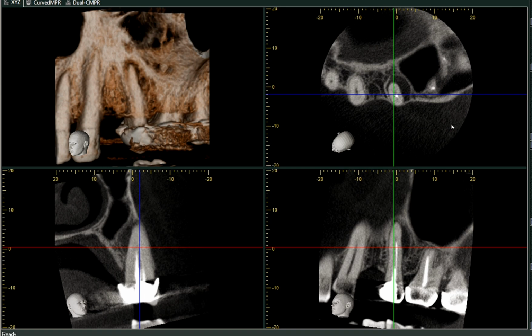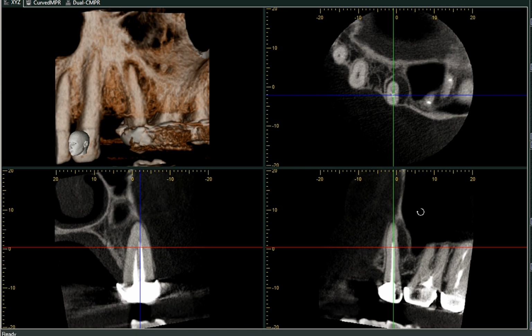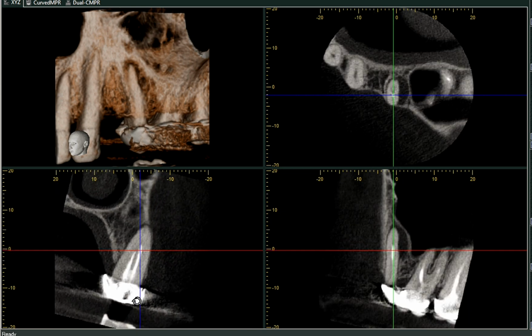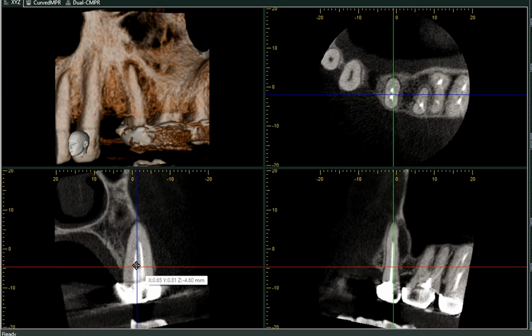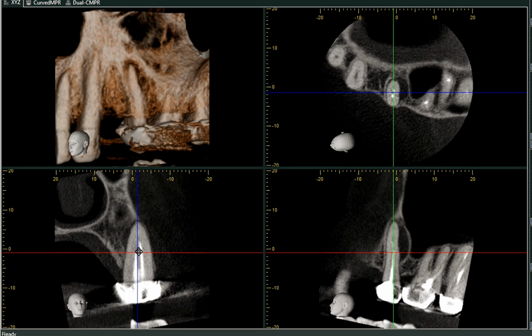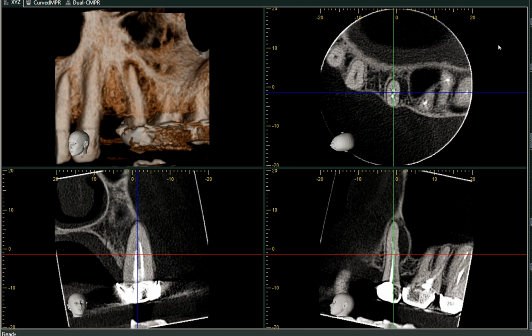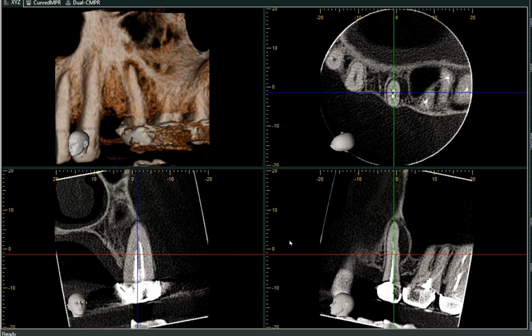So what was the reason behind the periapical pathology? The tooth gave a history of endodontic treatment, so root canal treatment was already done. As we can see, it's a single fused root, but there are two canals present. We can adjust the sharpness filter and hide these lines.